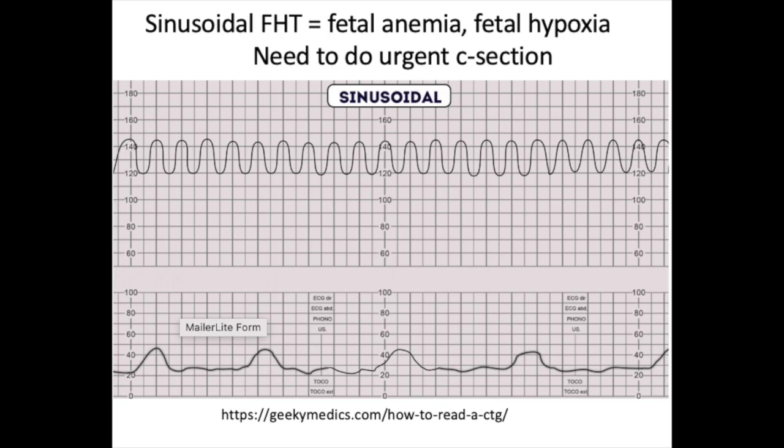This fetal heart tracing shows a sinusoidal tracing, and this always indicates fetal anemia or fetal hypoxia. This is considered a category 3 heart tracing, which means you have to do immediate C-section.